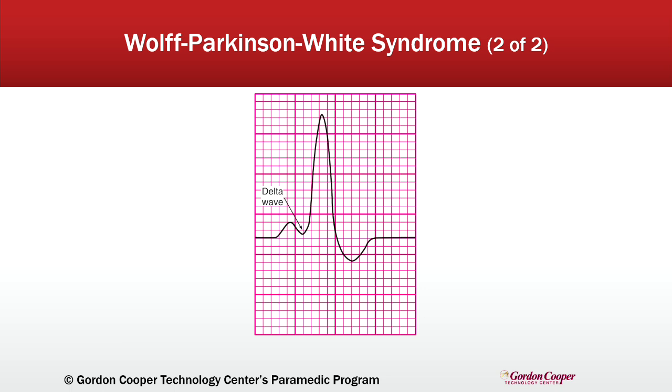So here's what we're talking about with that delta wave. You see how it's not nice and tight. We don't return to our isoelectric line or a baseline, and then we get this slurred upstroke here.